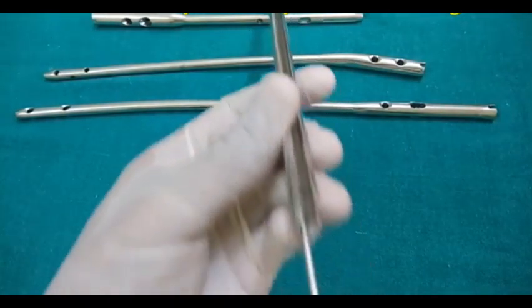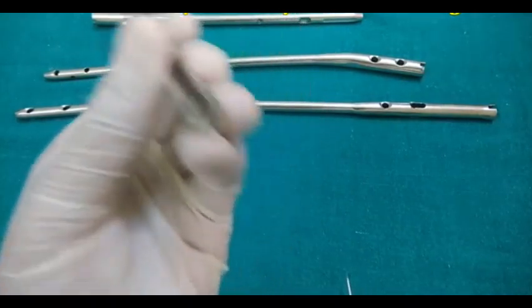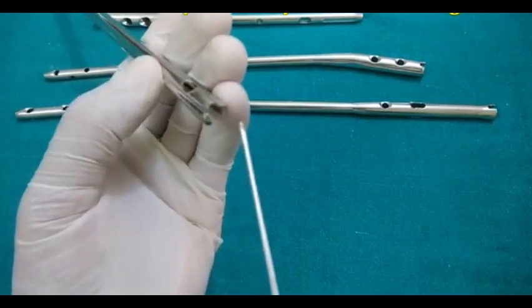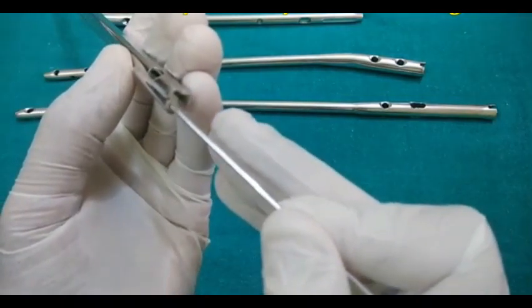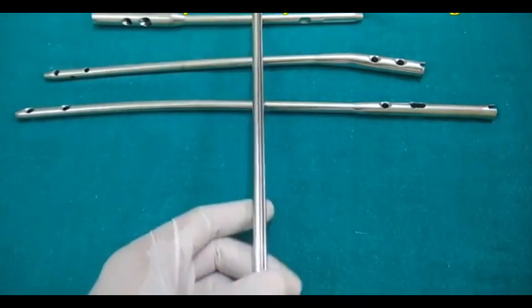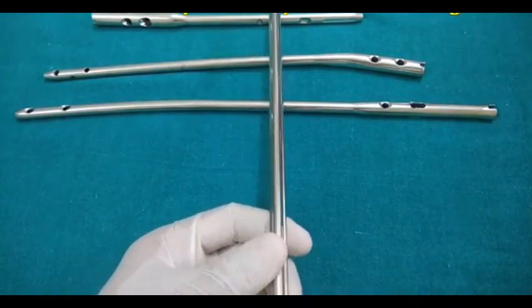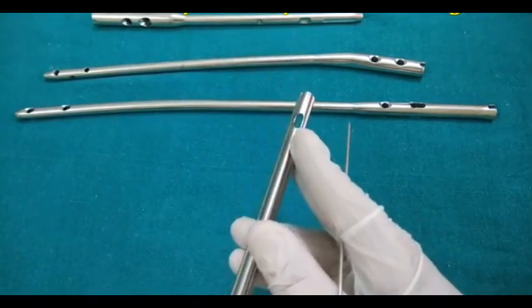Now this is the slot you can see, and the shape of the nail, or the cross section, is actually clover leaf shape. Now there is a plant which is clover, and it is not clove, just remember it is a clover leaf. You can see here that this is the cross section of this, and this gives a fixation in the medullary canal, the slot, and opposite to the slot is the eye. You can see that this is the eye on one end and on the opposite end.